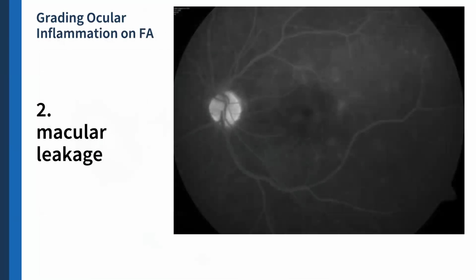Okay, so next, so macular leakage. So in this one, I'm sure you guys will be familiar with this na dapat the normal macula should have the foveal avascular zone, so there should be normally dapat medyo shall we say devoid of dye yung area of the fovea and macula. So any signs of leakage there is abnormal.